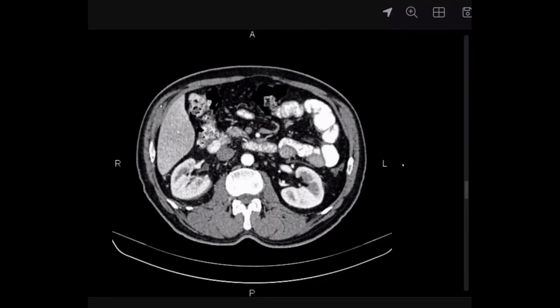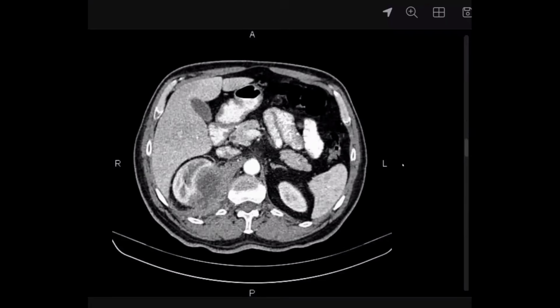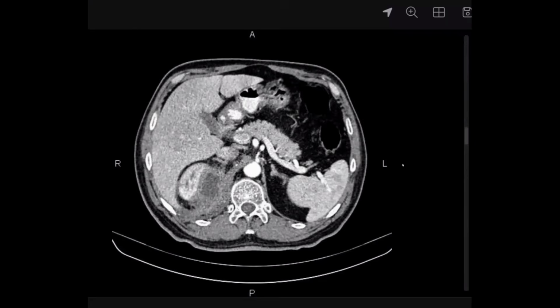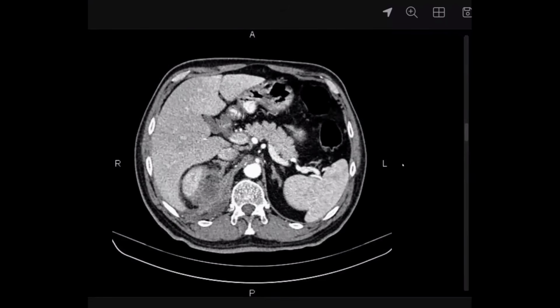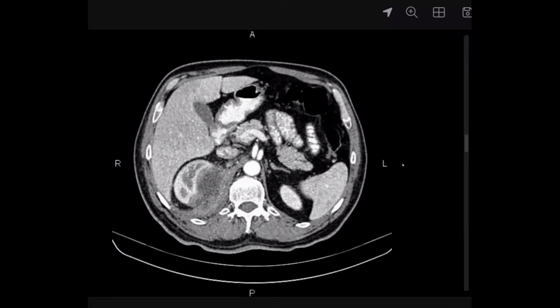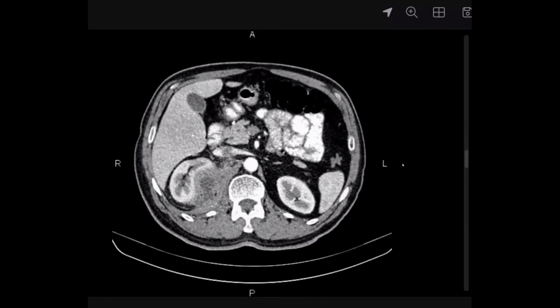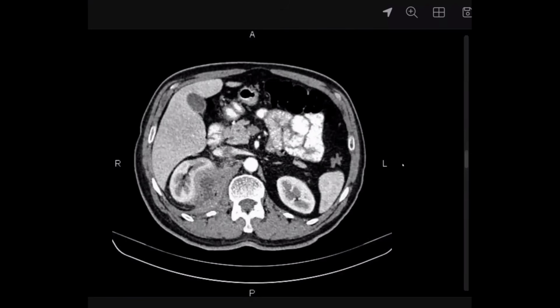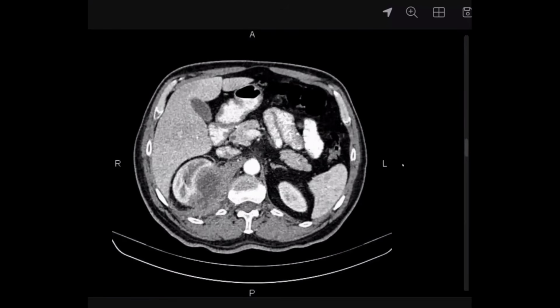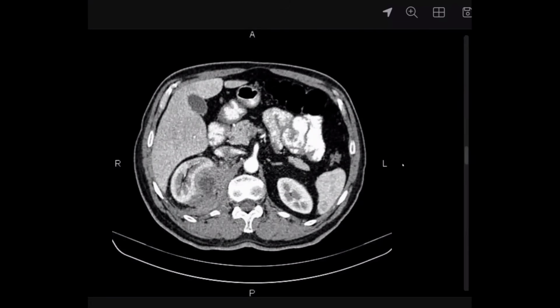What's your diagnosis here in this case, please? If there is any history of fever, then this can be due to some abscess within the kidney, which is extending into the perinephric space. Yes, correct. I want to add, this is another example of perinephric abscess because it's very important. What is the most common organism or bacteria in any case of perinephric abscess? Usually these are gram-negative bacteria, E. coli, Klebsiella. E. coli, you are right.